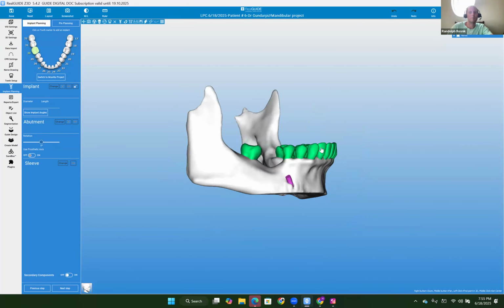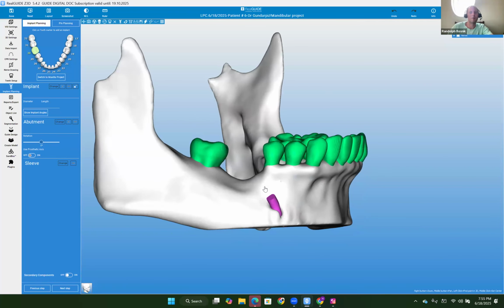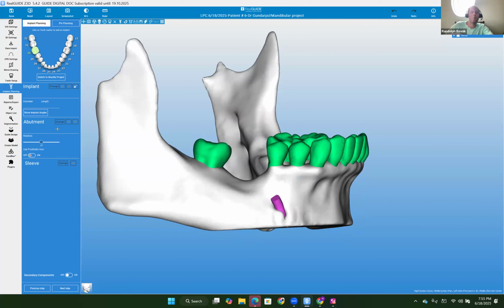Okay. So let's just start at this view right here, Hussein. So what we can appreciate from this view here is go to the neighboring CJ there and draw a line there, Hussein. So you can see all the bone that she's lost at this site number 30 there with the height wise there. So she's lost probably about 4 millimeters of bone height wise there. Now to graft that, it's going to be rather difficult to try to reapproximate that bone to the level there. So let's see kind of what we have left there, Hussein.